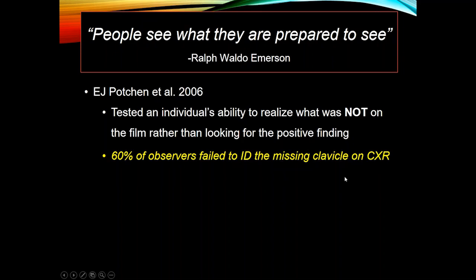So it's really important to be aware of what the normal anatomy is and the normal variants, so that you can more easily recognize when something is missing. On every case, for example, I always track the vasculature, but particularly in the liver, looking at arteries and veins, so that I know that everything that should be there is present. And the only hint may be that there are secondary signs of end organ ischemia.